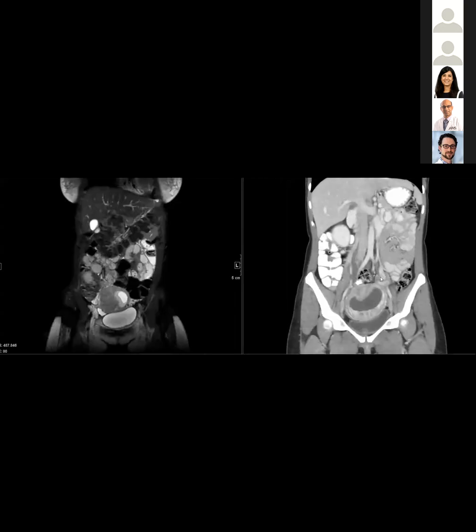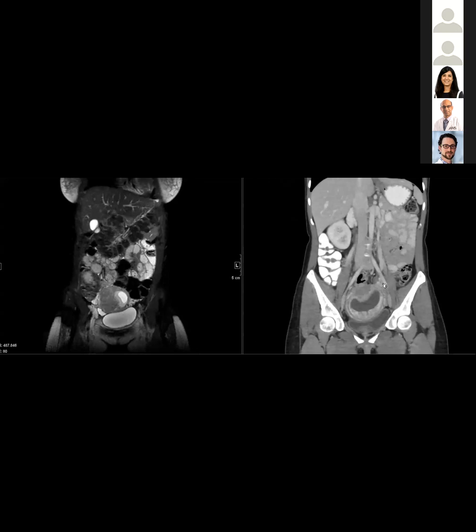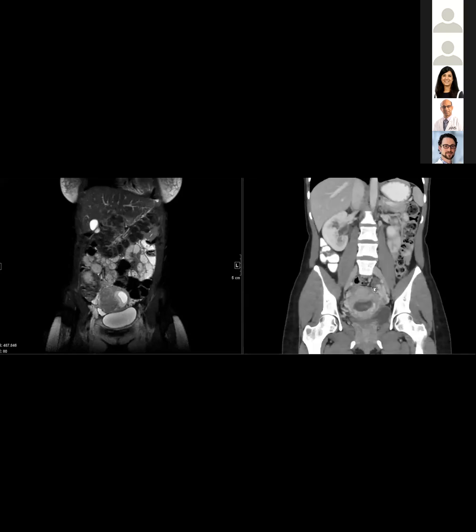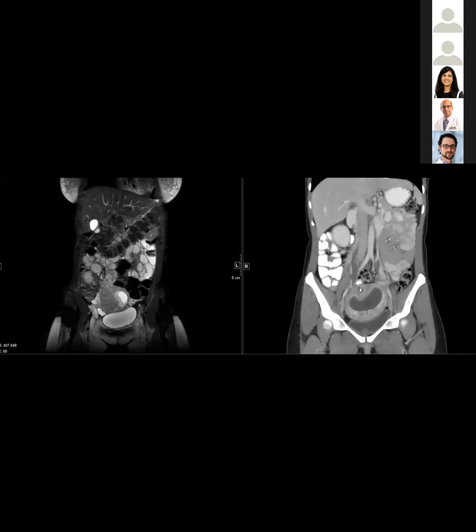When we compared the two veins side by side, right? Because first I was like, I don't know, maybe it's just non-mixing or something like that. But you can see that this part of the gonadal vein next to the ovary is not opacified, and then the left gonadal vein is perfectly opacified throughout. So if this was some sort of admixture, maybe there was reflux into the gonadal veins, then it would have been symmetric. So it seems like she has a gonadal vein thrombosis.